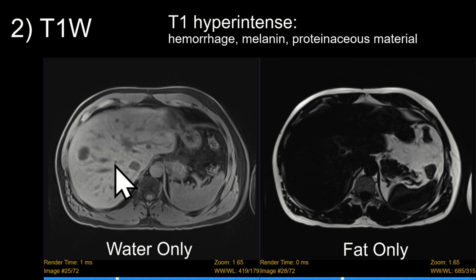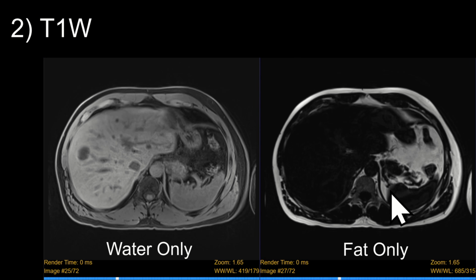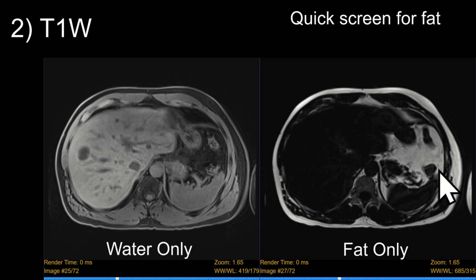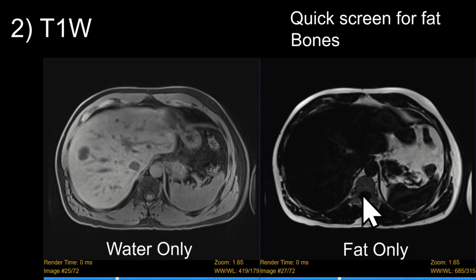Remember the things that are T1 hyper-intense, most importantly for liver MRI, hemorrhage, melanin, and other proteinaceous material. This image here on the right is the fat-only image, and as a reminder, the fat-only is going to show you both bulk fat and intravoxel fat. So this sequence is helpful to quickly identify fat in lesions and also to look at the bones. So normal fatty marrow is going to be relatively hyper-intense, so marrow-replacing lesions are going to show up as relatively hypo-intense.